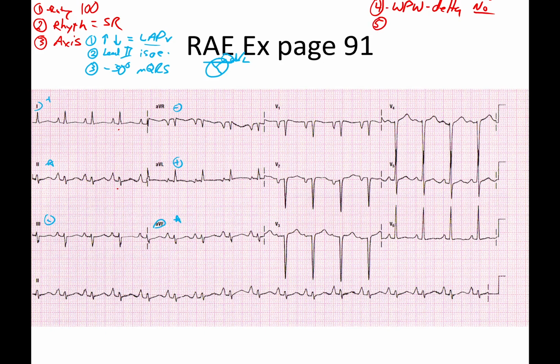Alright, so step 5. What are we doing for step 5? I'm going to go ahead and give this one a, we'll stick with red. We are going to look at the P waves in lead 2 and V1. And so the P waves here are tall. I mean, check that out. Really look at this. That P wave is taller than the QRS. Even this one's a little bit tall as well. aVF has a nice tall P wave.